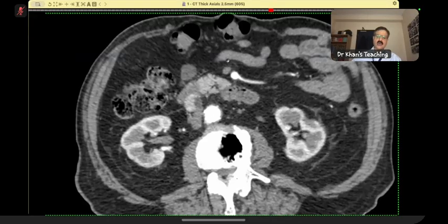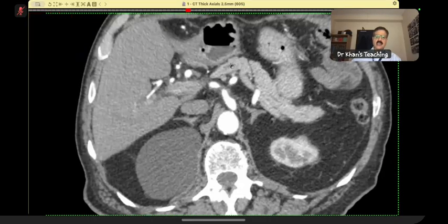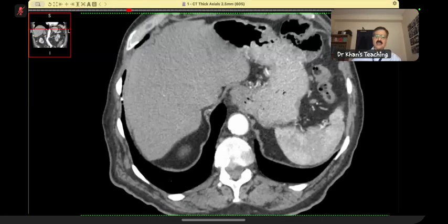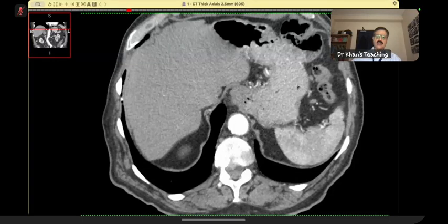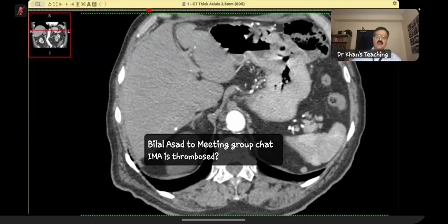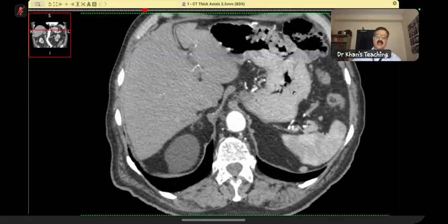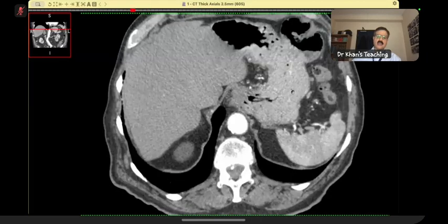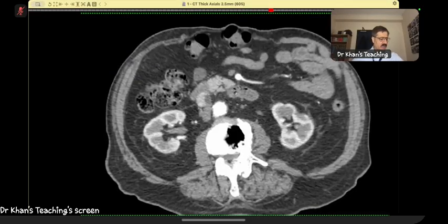As soon as you have picked up a gastrinoma, you should look for three things. First, multiple lesions, you did very well, where you said that you will look for multiple lesions. Second, metastasis, you did very well. But the third thing is to look at the stomach. What do you think is happening to the stomach? These are what we call rugal folds. You have to develop your eyes to differentiate from wall thickening, but these rugae are thickened. When you pick up that thing, you can confidently say that this is suggestive of rugal thickening. With rugal thickening, it becomes Zollinger-Ellison syndrome. So these were the few points in the feedback. Otherwise, you did very well. Well done. Thank you, sir.